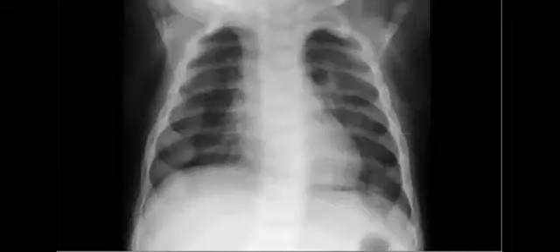So it can be something like osteogenesis imperfecta, or renal osteodystrophy. If this patient has chronic renal failure, then it is not linked just to vitamin D deficiency. It will be linked to other types. Sometimes they also like to show you the rickety rosary beads, or rickety rosary, and this one.